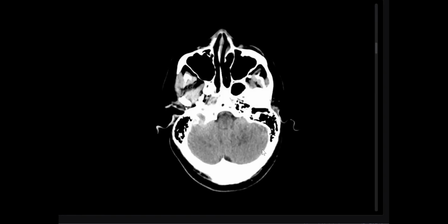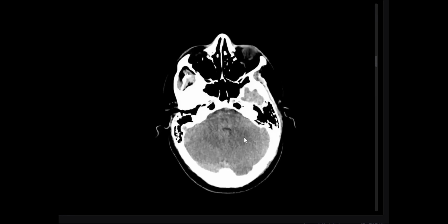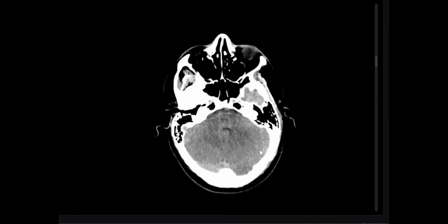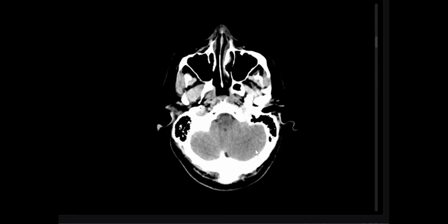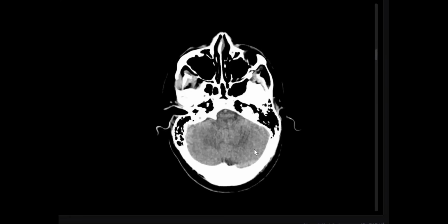So there is no tonsillar herniation. However, there is effacement of the fourth ventricle and hypoattenuation around. It is a patchy hypoattenuation around the cerebellar peduncle. You can ignore it. Some artifacts occur multiple times at the posterior fossa. I'm the examiner, I'm telling you, ignore it.